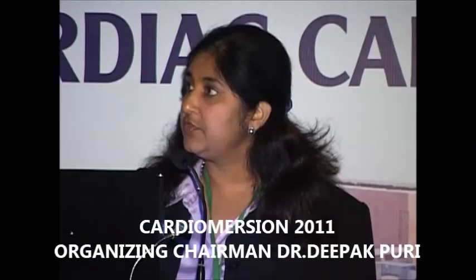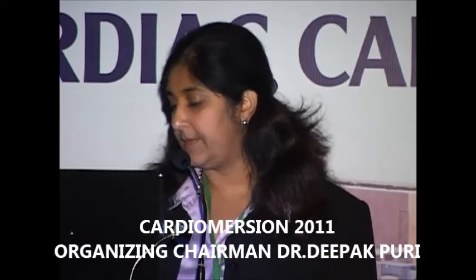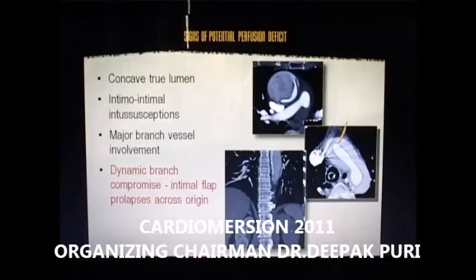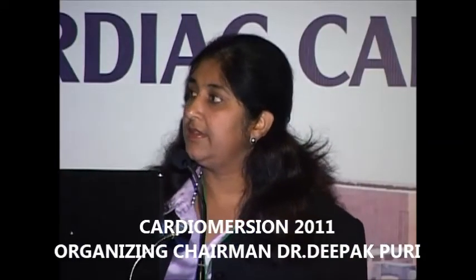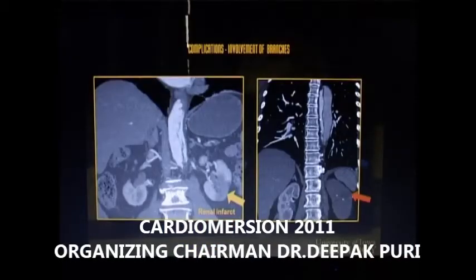This is involvement of the branch vessels by the aortic dissection: the celiac, the renal, right renal, and into both the common iliacs. Now, signs of potential perfusion deficit are very important because they determine how quickly we should intervene and where we should intervene. As you can see, dynamic branch compromise has sometimes been observed on the TEE, which we cannot image on CT. And this is an example of a renal infarct secondary to aortic dissection, where we lost all the perfusion of the kidney. So this ancillary information is very important.